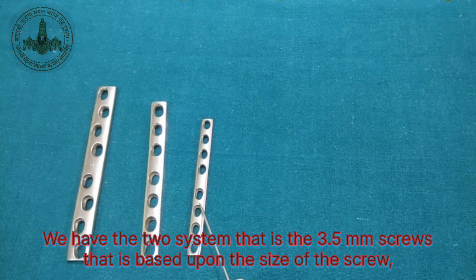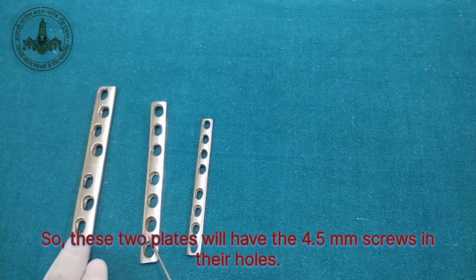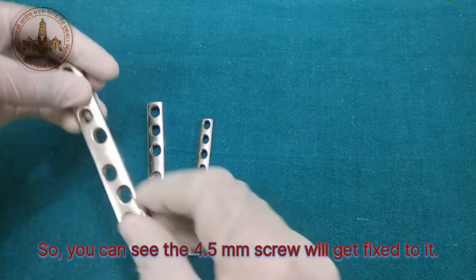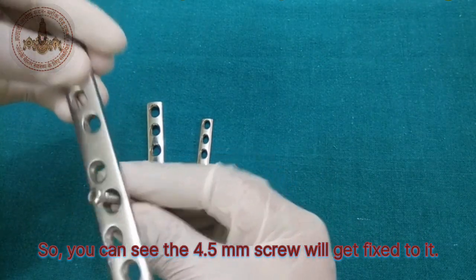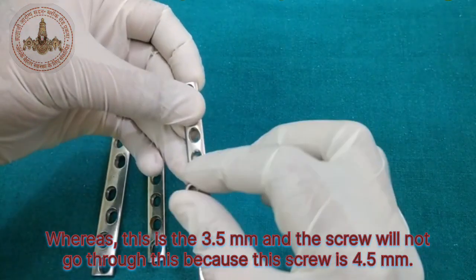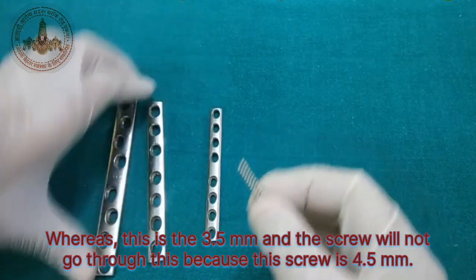We have two systems, based upon the size of the screw, the diameter of the screw: the 3.5 mm screw and the 4.5 mm screw. These two plates will have 4.5 mm screws in their holes. You can see that the 4.5 mm screw will get fixed to it, whereas this is the 3.5 mm plate, and the screw will not go through this because this screw is 4.5 mm in size.